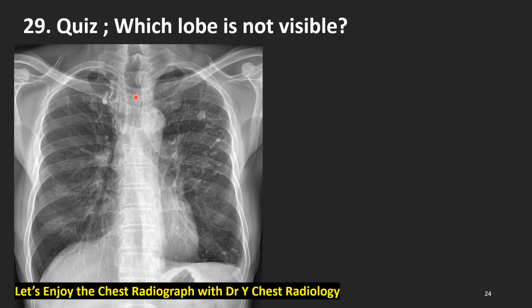This is the trachea, and the left main bronchus, left upper, left lower bronchus are okay. Right main bronchus is shorter than imagined. Bronchus intermedius is here. But how about the right upper lobe bronchus? This one is shorter, thickened, dilated. Yes, this is the right upper lobe bronchus, right upper lobe collapse and traction bronchiectasis after tuberculosis. Also, the left side shows stable TB findings here.